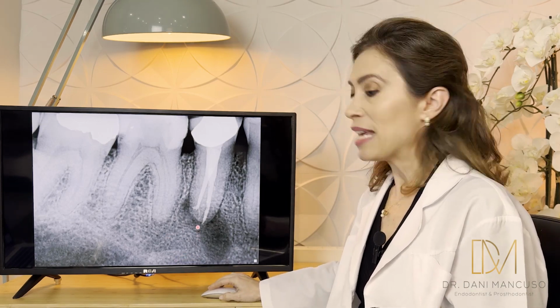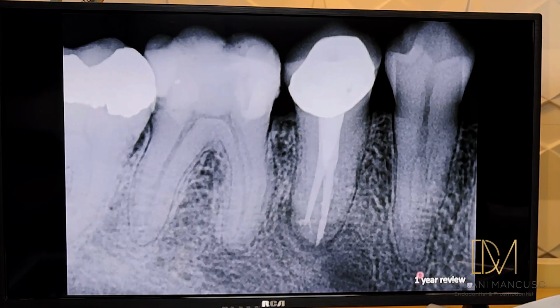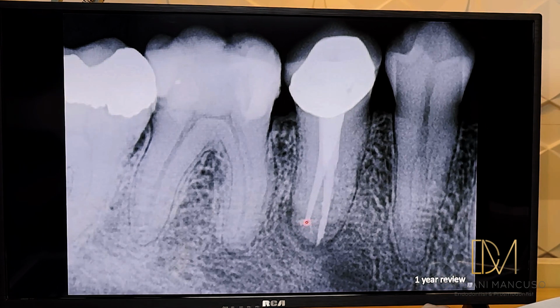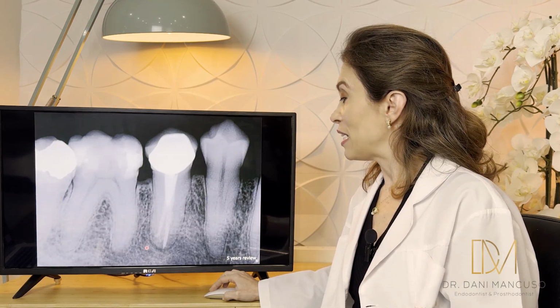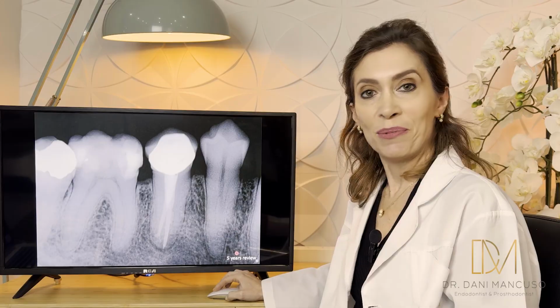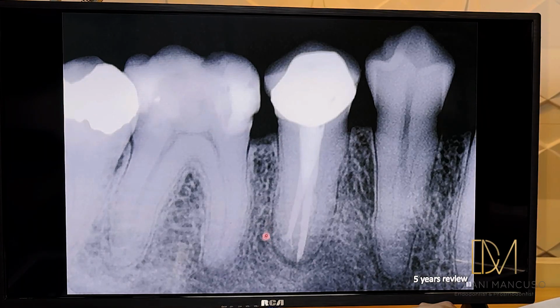You want to see healing. So I did a 1-year review. You can see that it was obturated with bioceramic. It didn't dissolve at all. It's very stable. And you can see already healing in this area. We also did a 5 years review. And now you can see the lamina dura all the way around this tooth again.